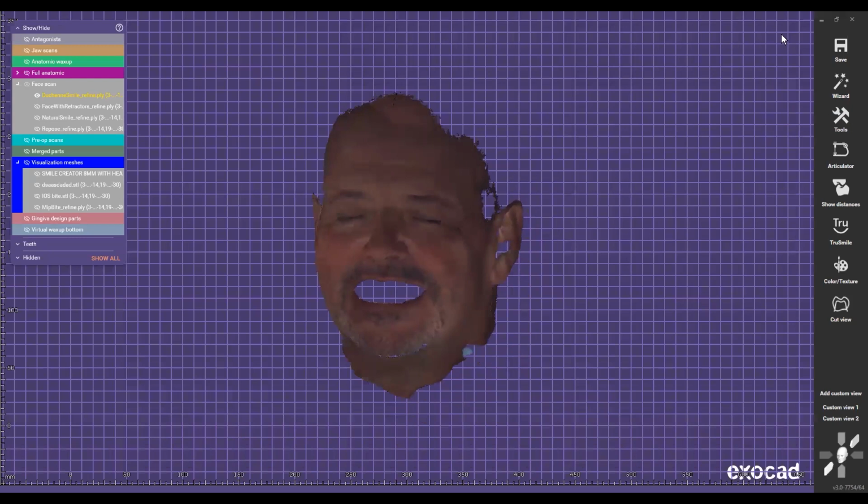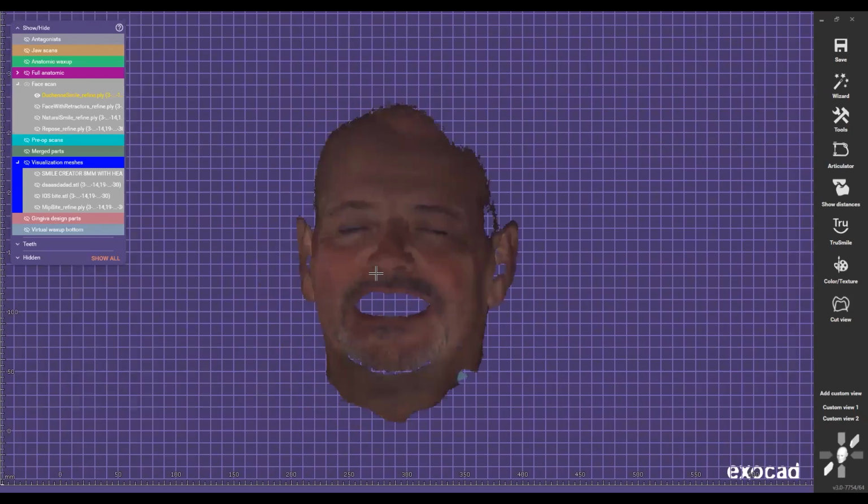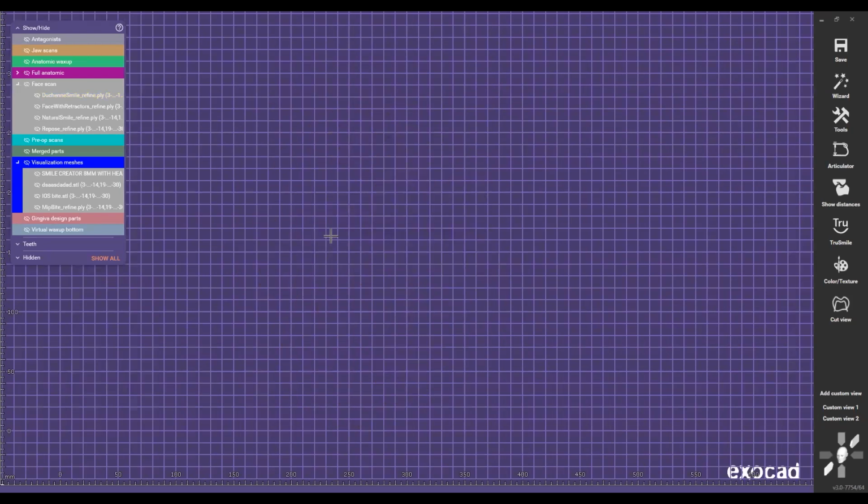There you go. So once I see this, now in this case, I already matched all the facial scans. I put the bite, I put everything together, right? But one of the things that a lot of dentists and technicians ask me is, how do you align the facial scans to the intraoral scans together properly, right? With your facial scanner, the Insta facial scanner.